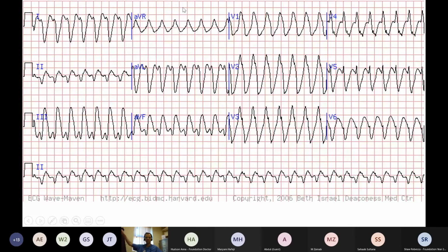So it's pointing up towards the right, the signal's starting in the heart. It's going up towards your right arm raised up in the air. So that doesn't really make sense if the rhythm is originating in the atrium. So we've got profound axis deviation, and we've got very broad QRSs. Very broad QRS points towards it being a VT.